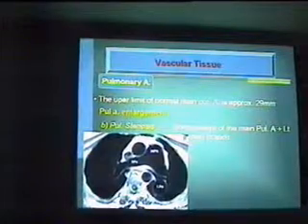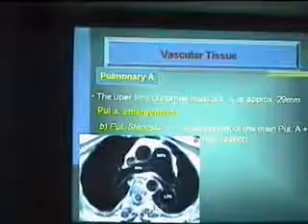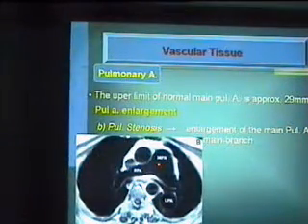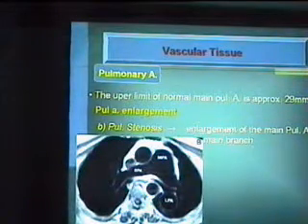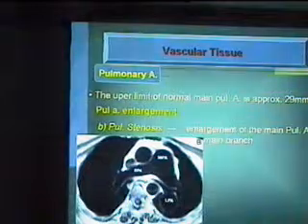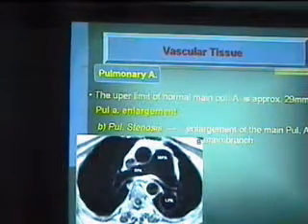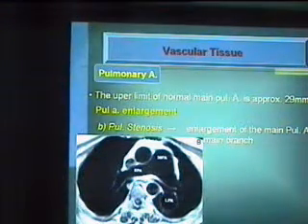ألاقيها أكبر من 2.9. تاني كوز pulmonary stenosis، عندنا what we call the post-stenotic dilatation. مش كده؟ ألاقي enlargement of the main pulmonary artery as well as the left branch. لا نفتكر كده، أشمعنى الليفت برانش؟ لما بشوفها على البي إيه فيو في الجست، ألاقي فيه الأورتيك ويست بقى الهارت ويست بقى convex due to post-stenotic dilatation.